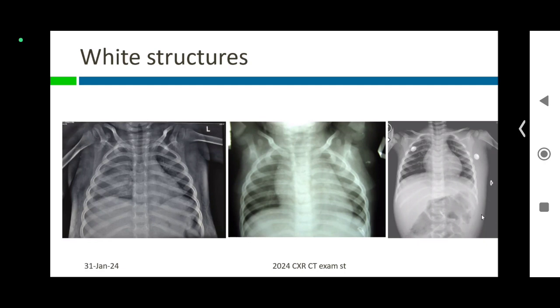And the last one. Sir, left side emphysema is there, sir. Sorry, subcutaneous emphysema, sir. Subcutaneous emphysema should be dark in color. Here it is, sir, white in color compared to right. Very good. It is unilateral. So if you are able to look at this, it is an ominous sign.